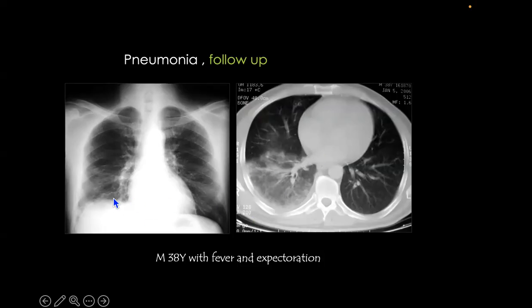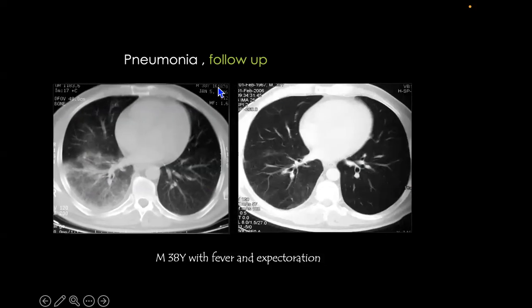This is how we see pneumonia. Nothing is clear here on this chest radiograph, but when we did the CT, there is a lower zone opacity or lower zone consolidation, after treatment clearing. There is a very important point concerning these follow-up radiographs and follow-up CT scans. Usually concerning pneumonias, we don't expect immediate radiological improvement because the patient receives the treatment, gets well, and goes back home.